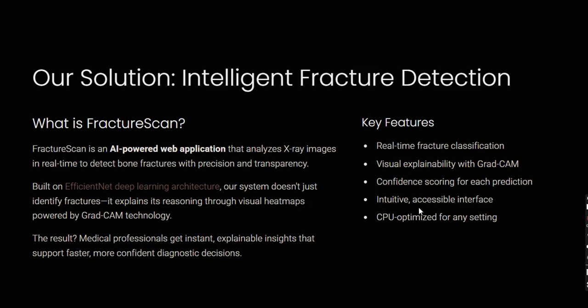The key features that we included: it delivers real-time fracture detection within seconds, provides visual explainability through Grad-CAM heat maps, and includes a confidence score to support clinical judgment. The interface is simple and intuitive, and the system is optimized to run on CPU, making it suitable for deployment in rural and low-resource healthcare environments.